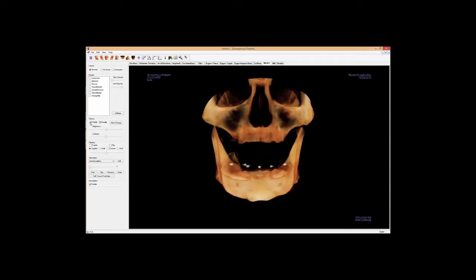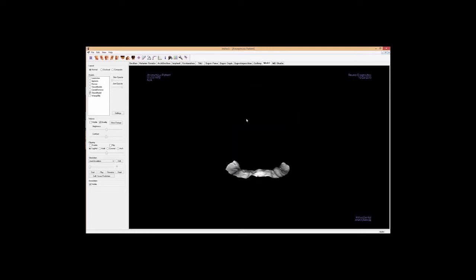And then in addition, we will have the stone model. So Anatomage has taken our model and optically scanned it using a laser desktop scanner. So we're getting really high accuracy. This is on the micron level, and that's really important that we have a very accurate model, because that's where we're basing the fit off of the surgical guide itself. So we have that model here, and then we also have this image of the denture.